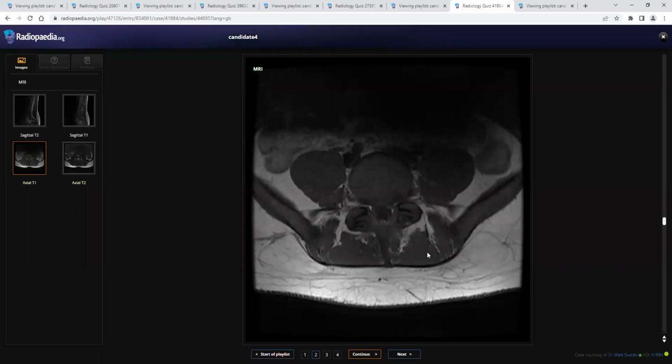So there is a tethered cord in this. Tethered cord with lower attachment of the cord. With neurogenic bladder, I would like to refer this patient to the neurophysician and also inform the findings about the cord involvement and neurogenic bladder. Okay.